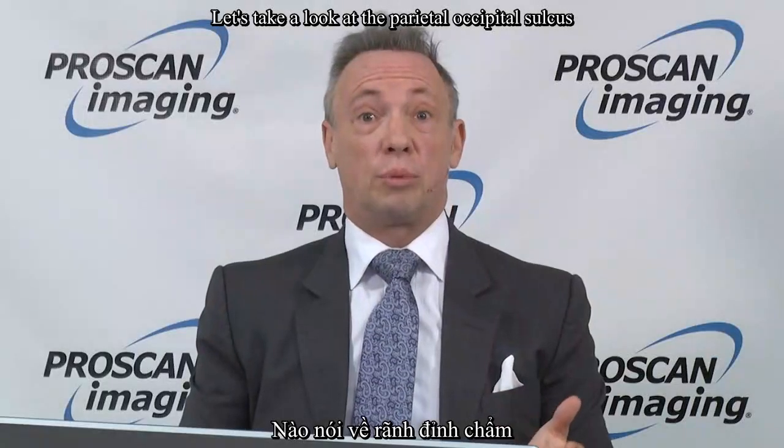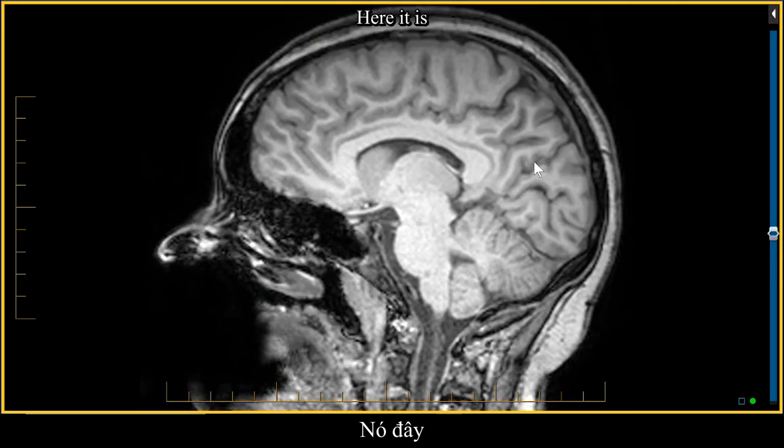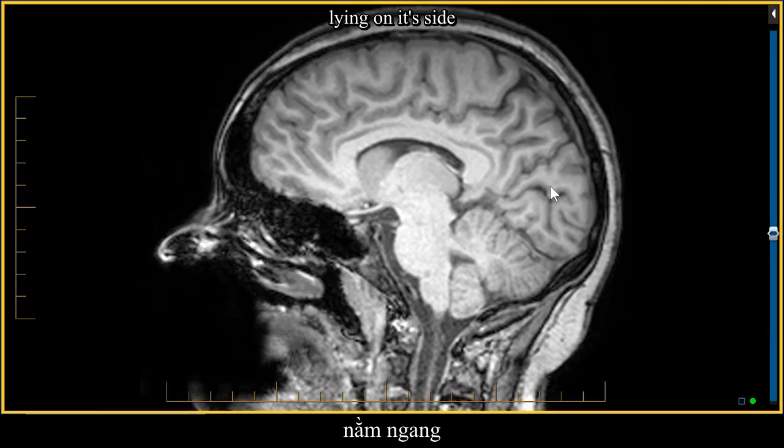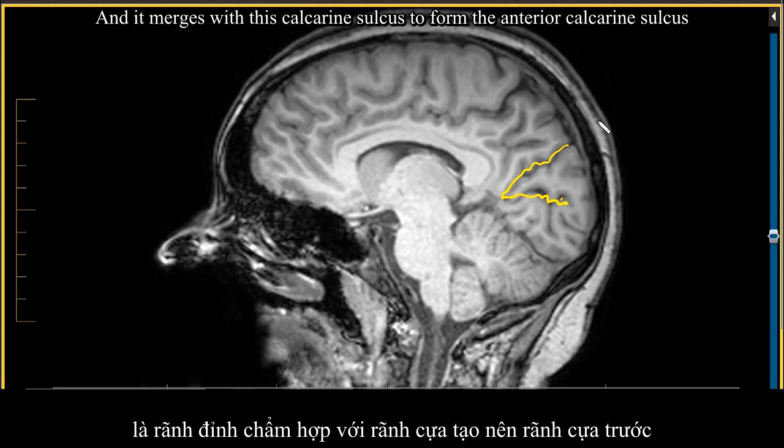Let's take a look at the parieto-occipital sulcus, which separates the occipital lobe from the parietal lobe. Here it is. It looks a little bit like the letter Y lying on its side. Here's our Y right here. And it merges with this calcarine sulcus to form the anterior calcarine sulcus.